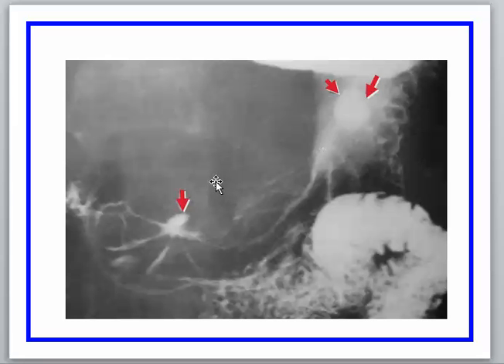Now, for differentiating between benign and malignant, the presence of smooth continuous lines radiating from the ulcer itself definitely points to a benign nature. A small ulcer is usually benign. A larger ulcer could be malignant. An ulcer on the lesser curve is usually benign. An ulcer on the greater curve is usually malignant. So we have these differences, and this is the appearance.